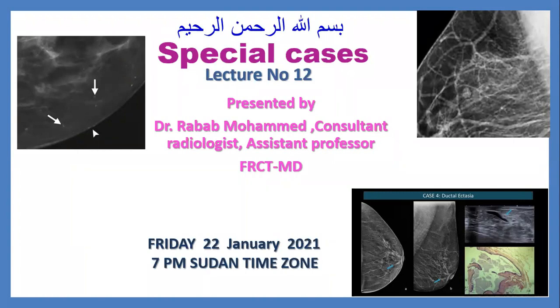We completed the 4 major mammographic abnormalities, the systematic analysis of the 4 major mammographic abnormalities, which are the masses, asymmetries, calcifications, and architectural distortion. And today we are going to do the special cases. So here, tell me, what are the special cases?